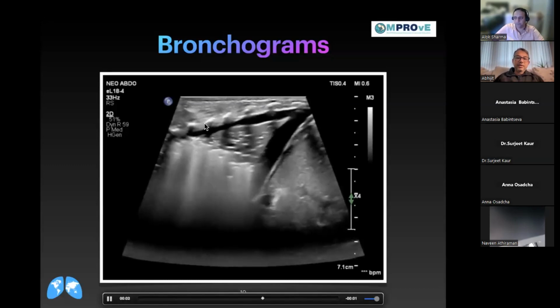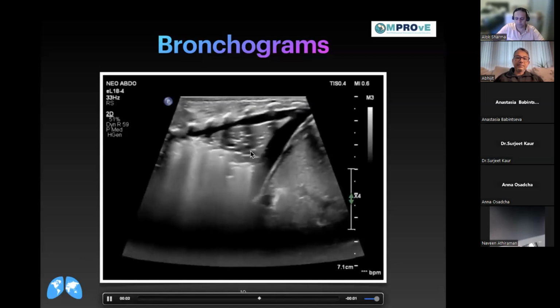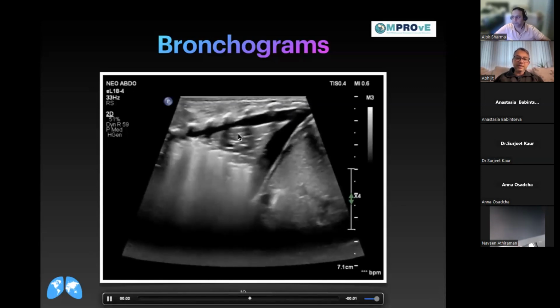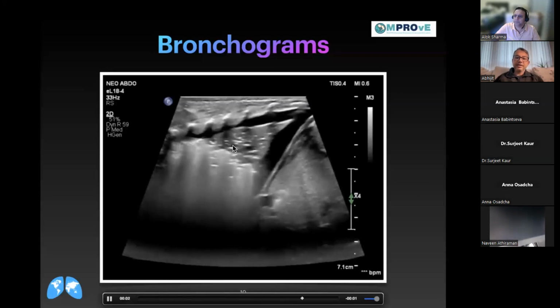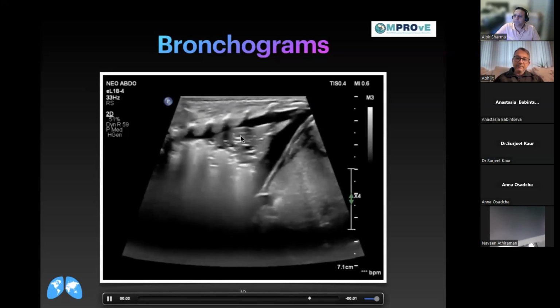So those are the lung acoustic shadowings from the ribs. So this blackness, this blackness, this blackness is just the acoustic shadowing. So ignore that part. In between those areas, you can see these bright speckles. If you can follow my cursor, these are the white speckles, and they are sort of making a crescent around the anechoic area, the black hollow areas in between.